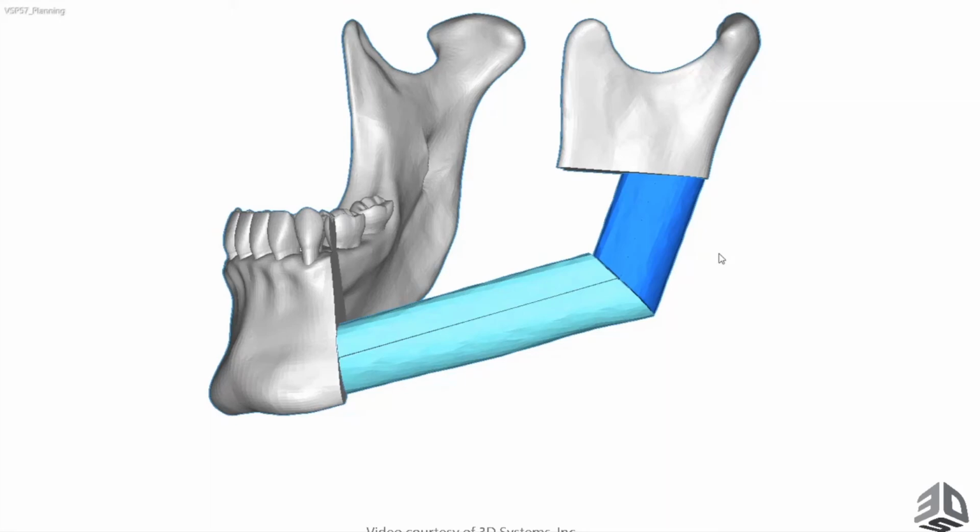patient specific versus a more generic cutting guide in terms of the superior inferior aspects of the cut. Of course, the oblique nature of the cut's the same for both guides, and that allows you to bring your neomandible together with the fibular segments. But what the more generic guide allows you to do is compensate for the perforator position, because you don't know that until you start your surgery. Yes, absolutely. An example of a cross-section of a patient-specific guide as opposed to a more generic guide. That would be really helpful to demonstrate that.